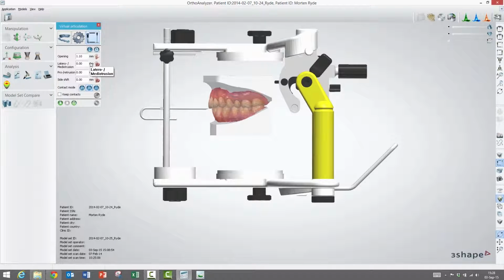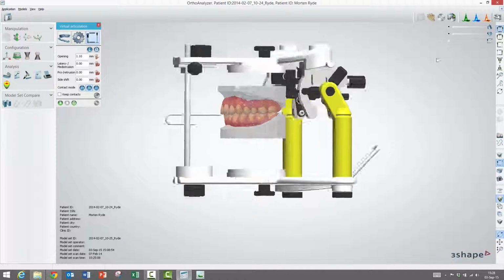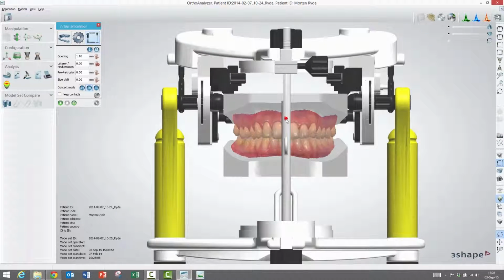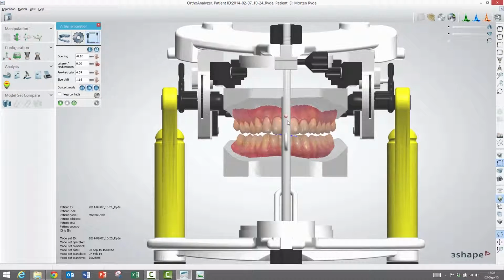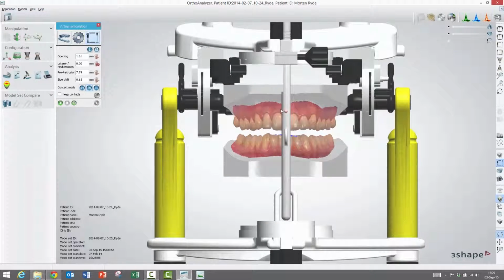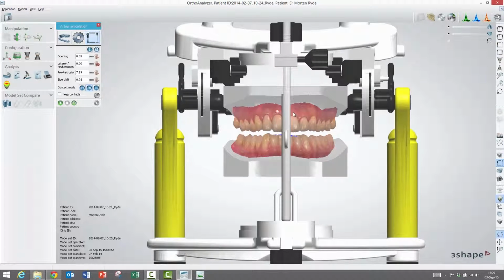So basically when you click the little hand and there's sort of a stop sign over it, it means that you have locked this into the constraints. Exactly. So if I take one of the movements, the lateral movement, for example, if I left click, you see you have this red dot. If I left click and try to hold and grab the pin, I can only open the mouth, but I can't move it sideways, because you locked that lateral medial movement.